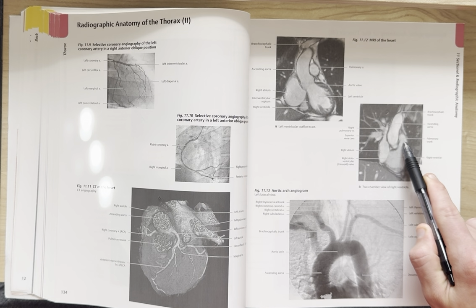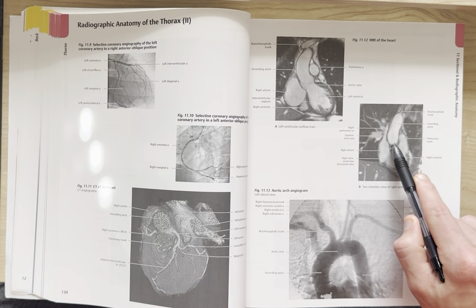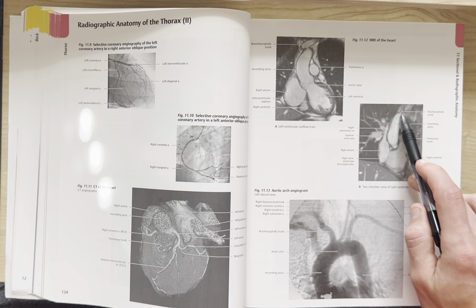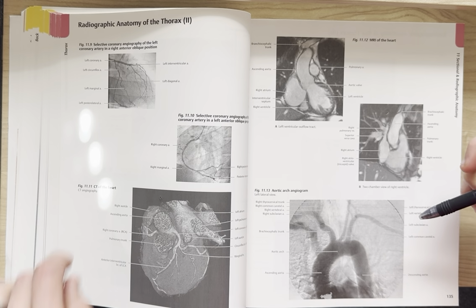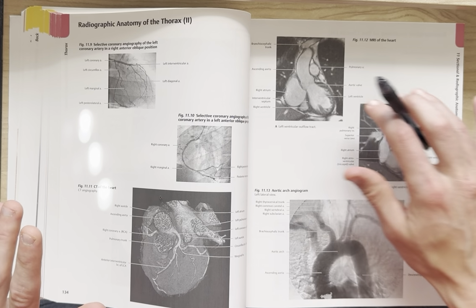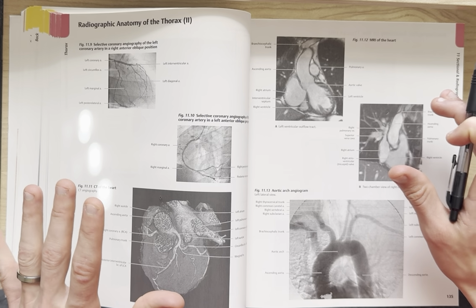Here's your pulmonary trunk, your ascending aorta, which is where blood is coming out from the left ventricle. And then there's your brachiocephalic trunk again, so just a different view. Pretty incredible that we can get this imaging, and it looks just kind of like blobs and masses if you don't know what you're looking for, but once you're oriented, you're like, well, wait a second, this is pretty incredible.